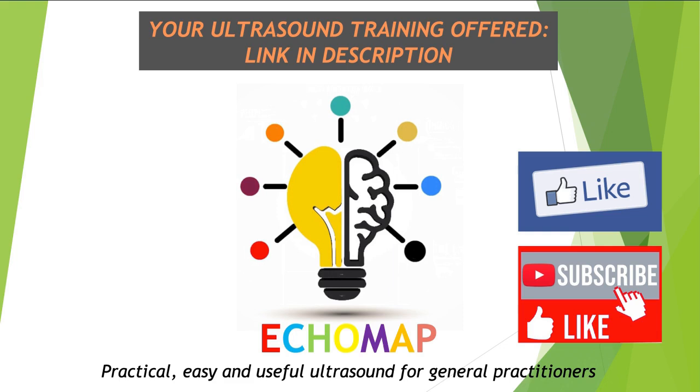So I hope you enjoyed this training, that this little lesson on suspicious lymphadenopathies was helpful for you, that it brought you a lot, and that it really refreshed the suspicion criteria in your mind in a very clear way. We looked at several examples, and it was really a chance to review the key points about suspicious lymphadenopathy in particular.